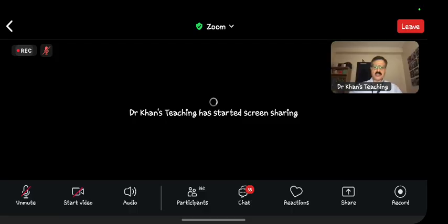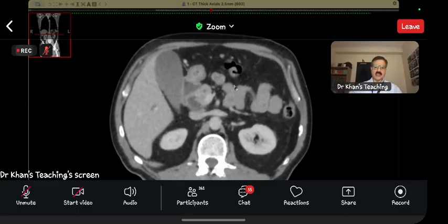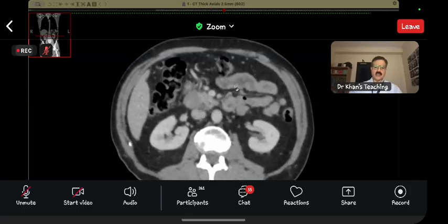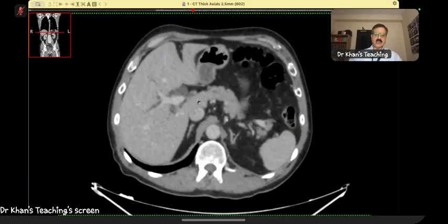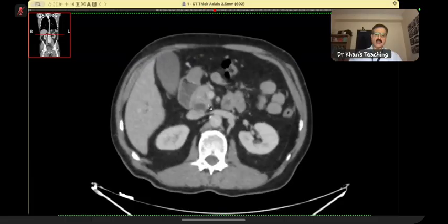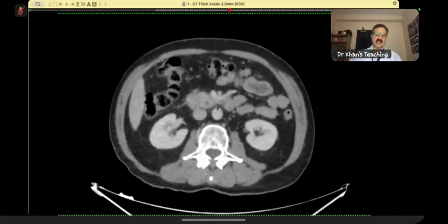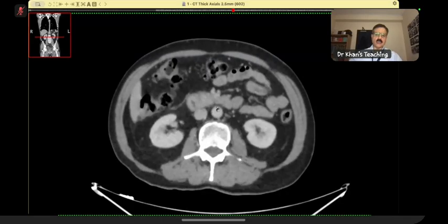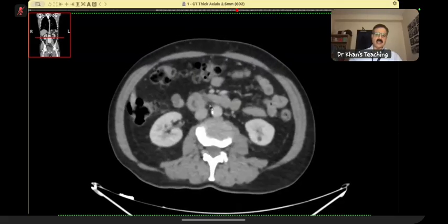So I will show you the pre-procedure, because that per se can also be an exam case, but this is how the patient presented initially. The patient presented initially with a dilated CBD, and this CBD goes till the ampulla. Interestingly, the pancreatic duct is not dilated, so double duct sign is negative. Usually we see it in malignancy.